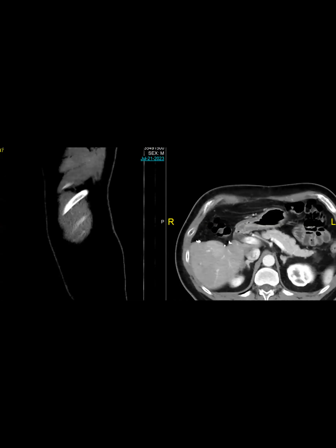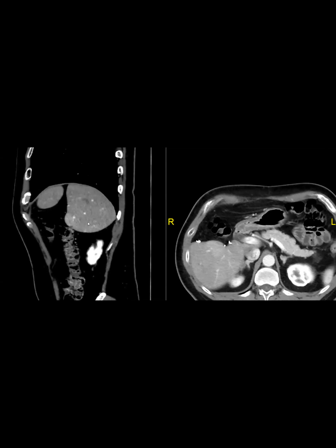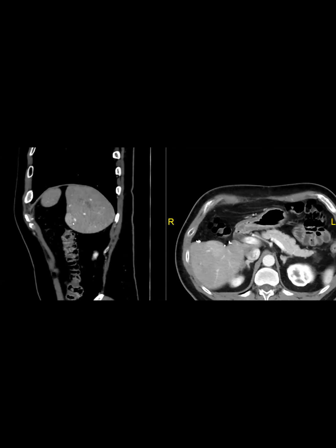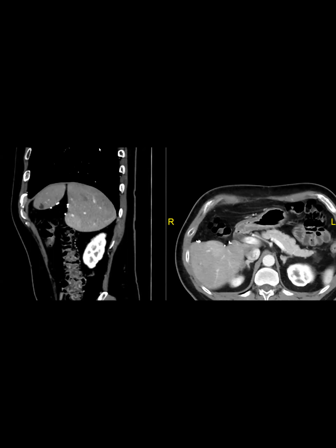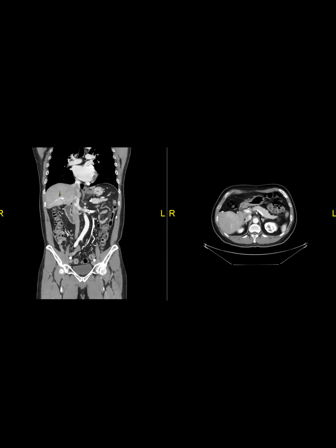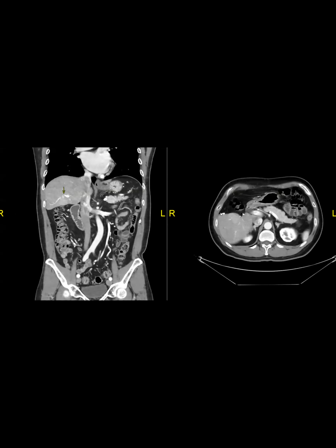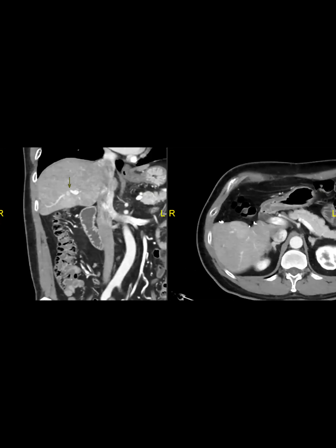However we turn it, it's just so geographic. So I was going to dismiss it, but it just kept catching my eye, just so big. And then eventually I found what I was looking for.